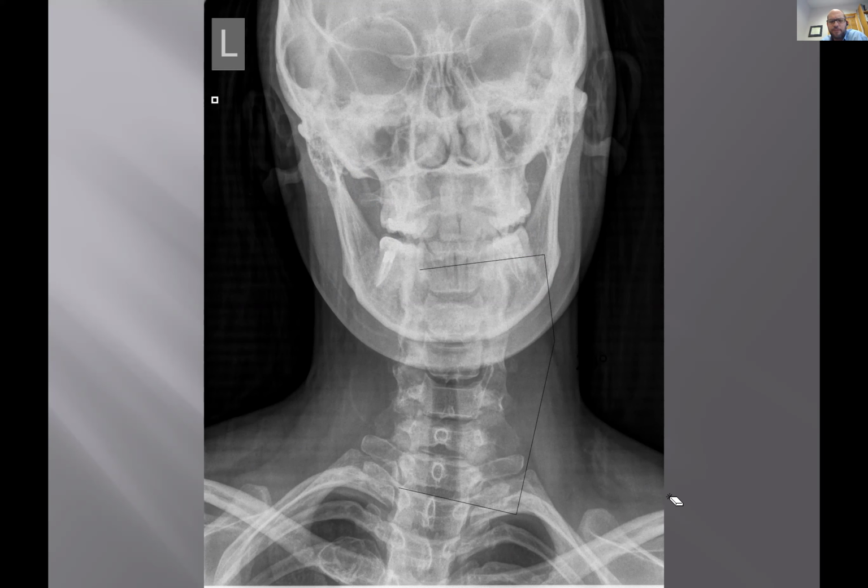Anybody see anything? Looking through the jaw, the C2 area looks kind of funky. Okay. Don't worry about this. It is funky because of all the superimposed structures. Okay, look down here, not right exactly there, but look on the lower half of the film, and something that doesn't look the same from side to side. The pain is going to be on the patient's, well, on the viewing left, upper back pain. Okay, what's popping now?